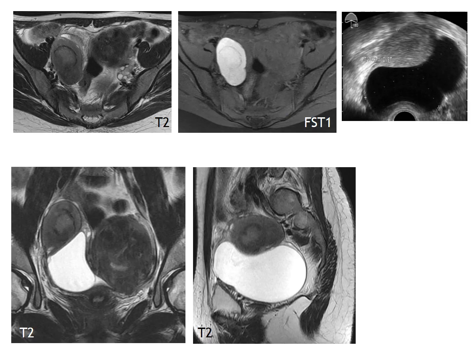Because of perilesional adhesion, often endometriosis is associated with peritoneal inclusion cyst, which is localized fluid collection due to peritoneal adhesion and adjacent functional ovarian tissues. Here you see an endometrioma that has high signal intensity at fat suppressed T1 weighted image and T2 shading. This cystic lesion adjacent to this endometrioma is peritoneal inclusion cyst. You can see endometrioma and peritoneal inclusion cyst at ultrasound.